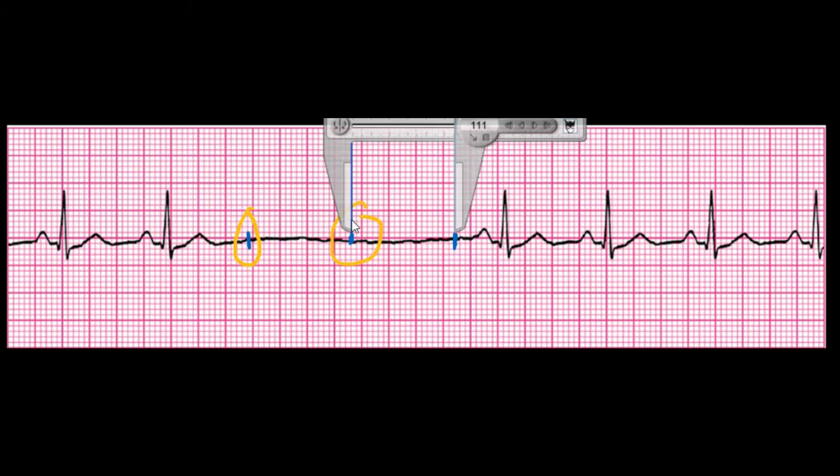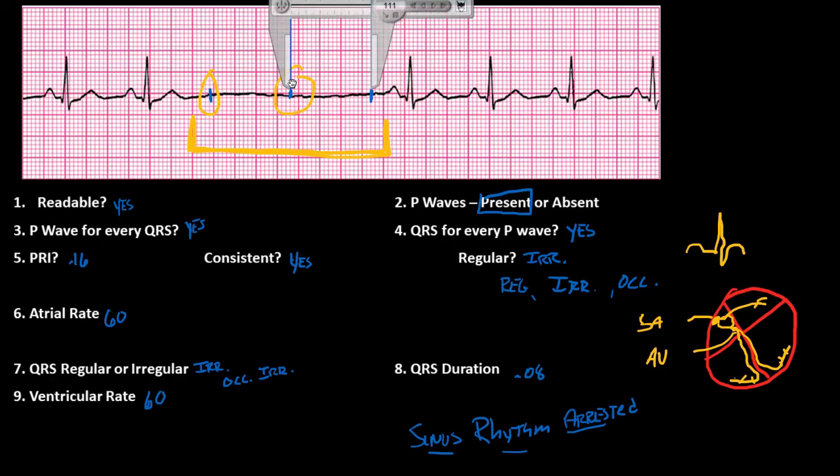The longer this pause goes, or this arrest, this is where we start to run into a problem of an individual having a potential syncopal episode. So when you check a patient and you find out that they have a great radial pulse, that's fantastic. Is it regular or irregular? And again, this kind of goes back to, I get the idea of doing an ECG on people. I really encourage it. I encourage 12 leads. When you get to ECGs, though, a lot of times you can detect what the rhythms may be based off of just checking for their pulse. So don't be afraid to reach down and touch your patient's pulse to see whether or not you can help identify whether or not there's an arrhythmia.